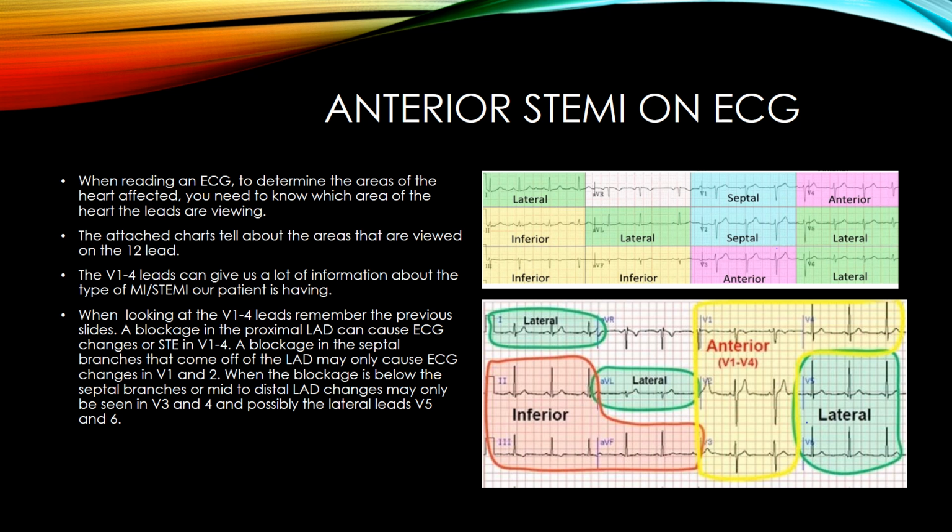Whereas some of your other graphs that you look at, they will tell you that V1 through V4 is for reading your anterior STEMI.